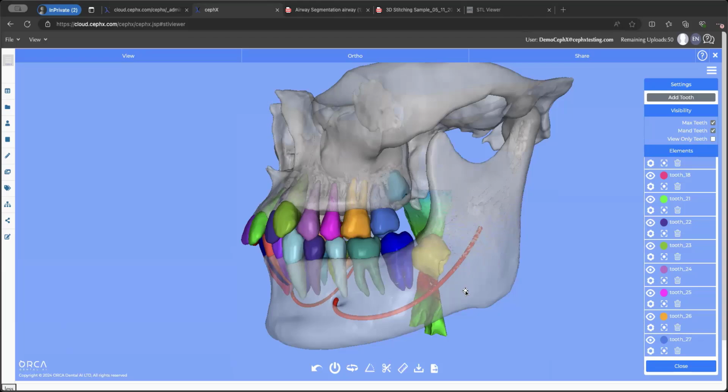You can upload a CBCT, and it will automatically generate, first of all, a Ceph. So it will pull out the correct slice, but it's not only one slice, it's like a mesh of slices, because an X-ray is naturally a mesh of bone. And then it will automatically also do the Ceph tracing for you. So if you want a Ceph tracing and you don't have a Ceph arm, you only have a CBCT, not a problem. You can upload the CBCT, and it will automatically generate the same Ceph that we saw before and the same analyses as before.